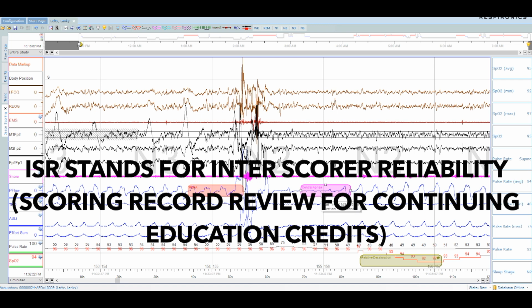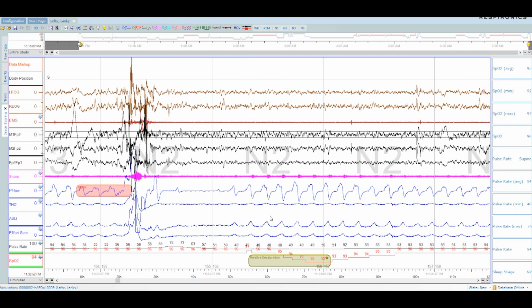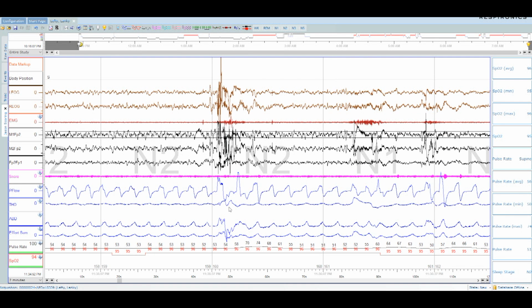Those aren't. You can see what I've been screaming from the mountaintops. Arousal, hyperventilation, post-arousal central. When you hyperventilate, you have no desire to breathe. Hence, the central apnea. And you can see there's no harm, no foul. There's no arousals after that. No one's waking up. Yeah, there's a blood oxygen desaturation because I'm not breathing and I hyperventilated. But you'll see that it stabilizes. Of course, until the next arousal.